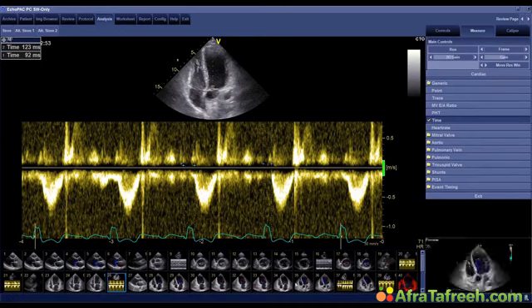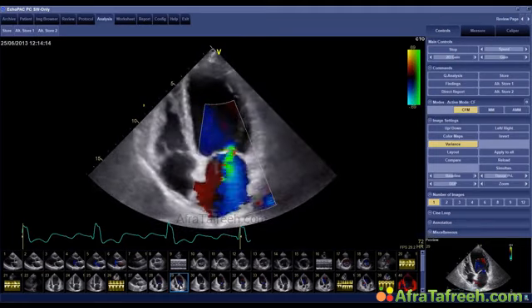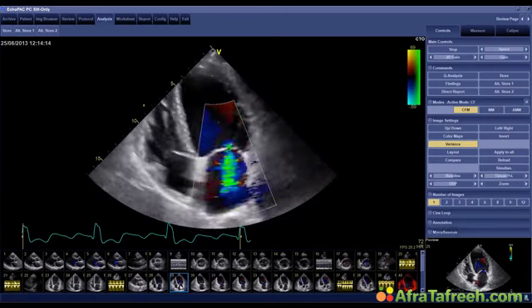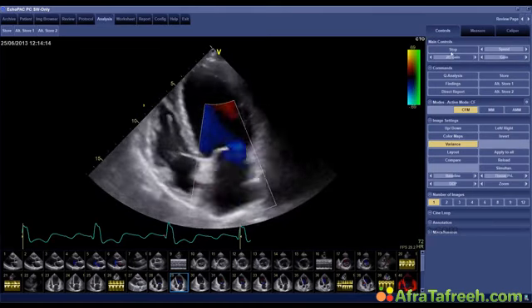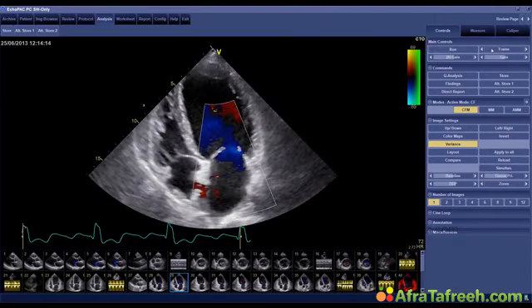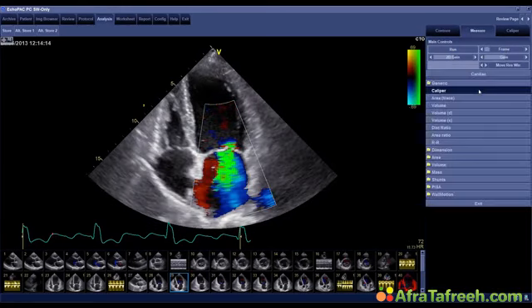Okay, but the next thing that I want to turn your attention to is the degree of mitral regurgitation. How severe do you think mitral regurgitation is? Well, I think there's not much doubt that it is very severe. You can see that there is a very broad vena contracta. If I stop the image right here, let me see. Here we go. There's a very big PISA here and a very broad vena contracta in the range of 0.7, right? So that is no question severe.